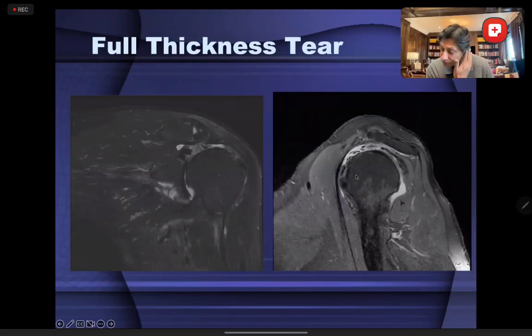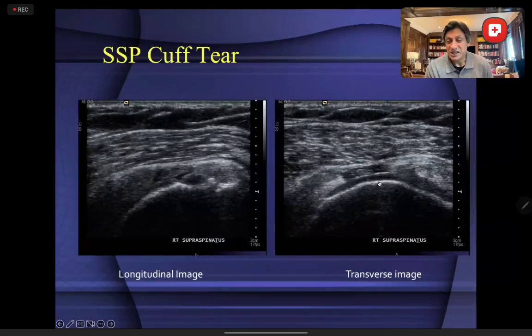Remember the scan we were looking at? The tendons are black in color, like this, the infraspinatus. Where is the supraspinatus? It's not there because it's completely torn. And what happens is, as it tears, it starts to retract. So then you have to tell the surgeon, where is the retracted tendon sitting at? What do you think? Where do you think the retracted tendon is sitting here on the coronal, on this particular? Above the glenoid. See, this is where it's actually sitting. That's part of the torn retracted tendon. This should have been here. So this is retracted.